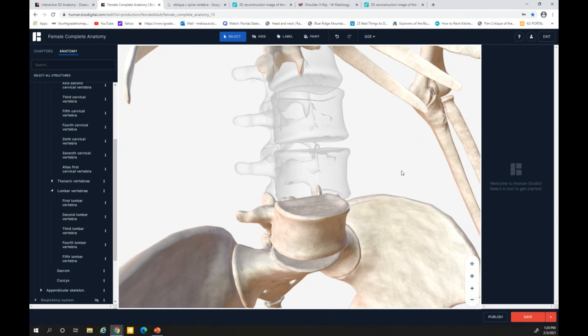So this would be anatomical, looking at that x-ray, the RAO, in an anatomical position, like we're actually looking at the x-ray. So I don't know if this helps at all. We'll look at this together again in lecture tomorrow live, so that you guys can let me know, and then we can try to figure out some other ways to visualize this together.